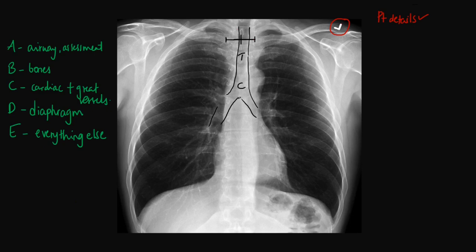This is the carina, the area which is causing the division of the airway into the right main bronchus here and the left main bronchus over here. Okay, and also if you look closely, you can also see the bronchus dividing into the right upper lobe here.